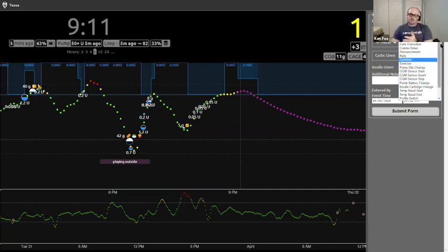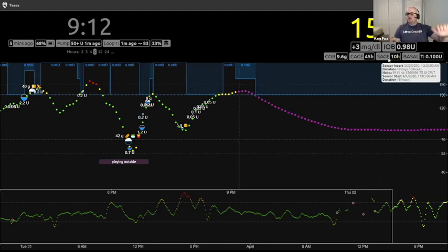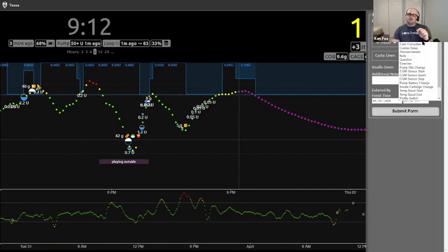So the Sage one, this is a good one. I showed you before how we did a restart today, which was very convenient. Sage. So I use 2 different activities for sensors. I do the CGM sensor insert, which you see here. It's not alphabetical, I know, I'm sorry. But CGM sensor insert is the one I use for a brand new sensor actually inserting into the body, is the way I remember it. And then CGM sensor start, you can do one right away when you push the start button. That's fine, but it's not really needed. I only use sensor start now for when we do a restart.